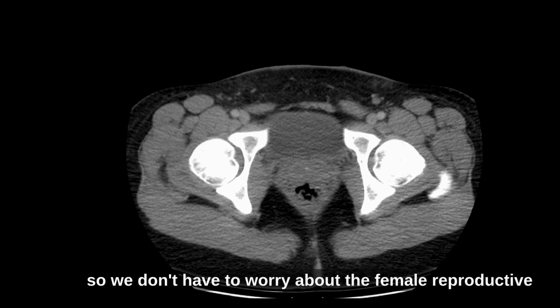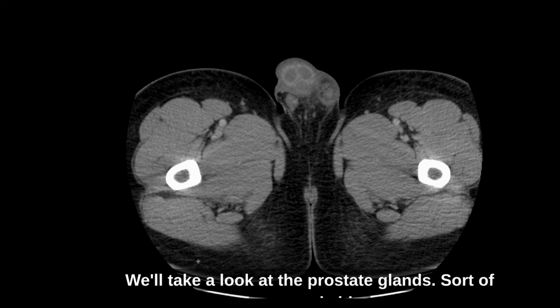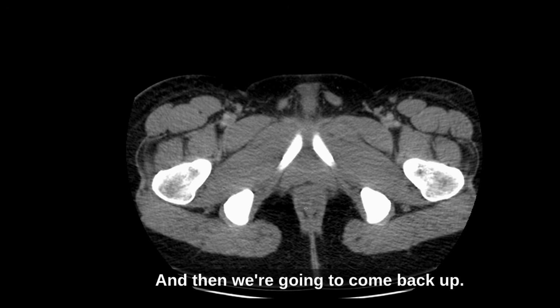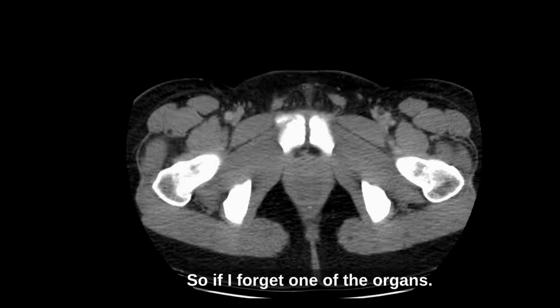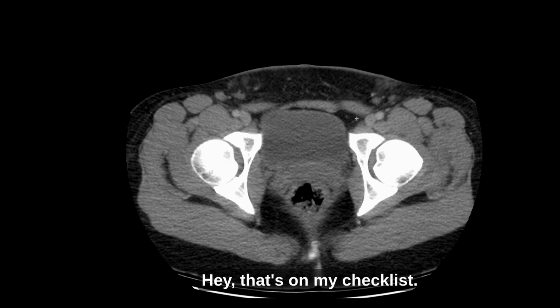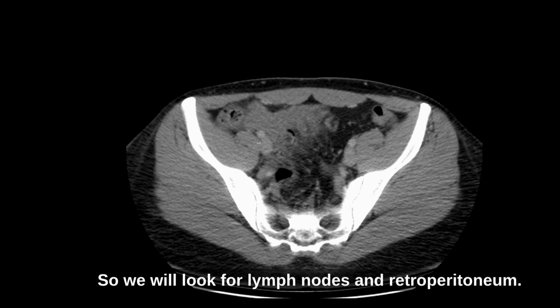This is a male patient, so we don't have to worry about the female reproductive tract. As you know, we'll take a look at the prostate gland, sort of unremarkable, and looking at the subcutaneous tissues. And then we're going to come back up, and I actually use a template, which is really helpful. So if I forget one of the organs, like, hey, I forgot to look for lymph nodes, that's on my checklist. I think it's important to have checklists. So we will look for lymph nodes and retroperitoneum.